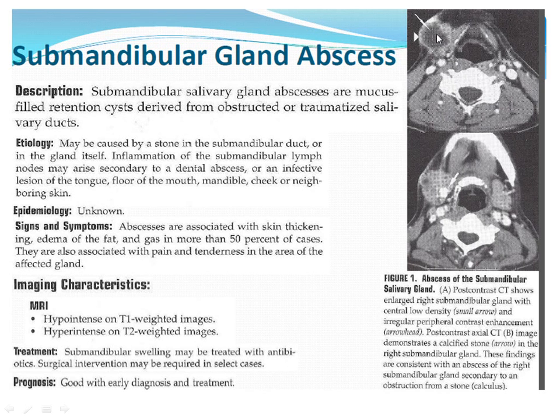On this one, this is showing a calcified stone that has developed within the gland. That's known as a sialolith. Sometimes the sialoliths can lead to obstruction of the gland, because normally your salivary glands are draining into your salivary ducts and into your mouth. So if it's obstructed, sometimes the material can get backed up and then occasionally get infected. Sometimes it can just cause enlargement and swelling of the gland as well.